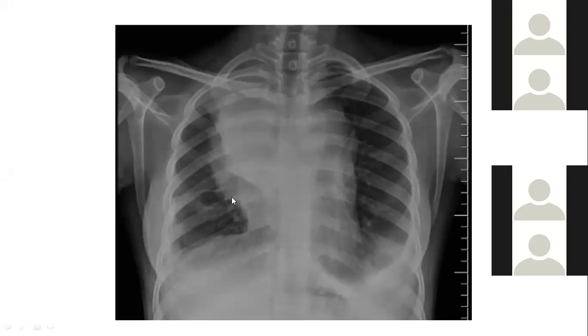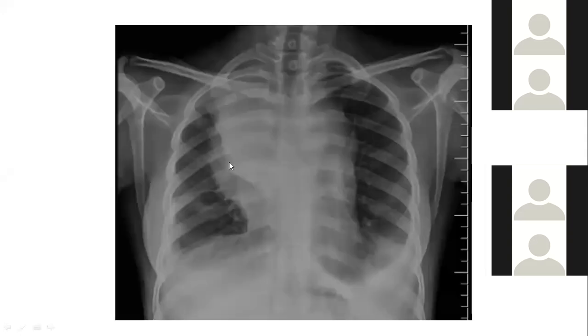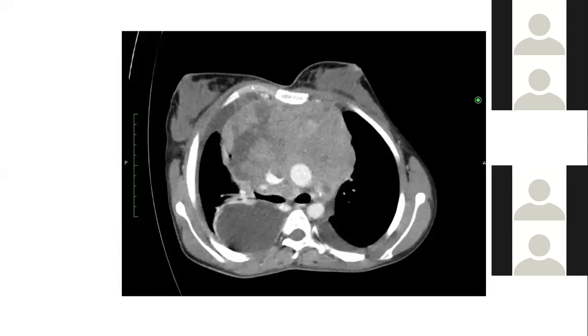So this is the CT scan of this particular lady. Now we can see this particular lesion which is enhancing, and there are a few non-enhancing necrotic areas, and there is again a loculated pleural effusion posteriorly. So that was the cause for the two lesions appearing on the radiograph in the right hemithorax. So again, this was a mediastinal lesion.